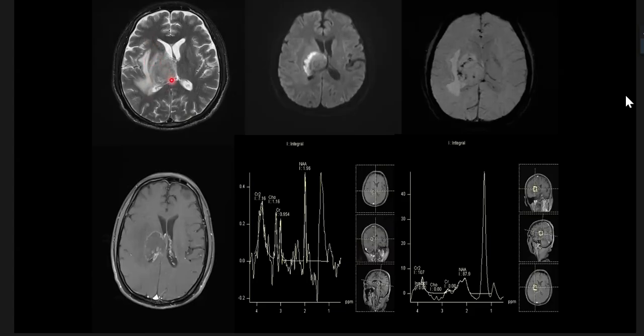Okay. So we have a well-defined intra-axial lesion situated in the right thalamus, fairly isointense compared to the gray matter on T2 weighted images, with some interspersed hyperintensity. There is a non-restricting peripheral area showing brightening, which could be vasogenic edema, not showing darkening on ADC images. Punctate areas of hemorrhage at the periphery, with a few subtle areas at the center. Post-contrast image shows thin, irregular, crenated margin enhancement along the margins, nothing in the central area, with surrounding non-enhancing vasogenic edema extending along the right ganglio-capsular region, right extreme and external capsule, with mild mass effect on the right lateral ventricle with minimal midline shift.